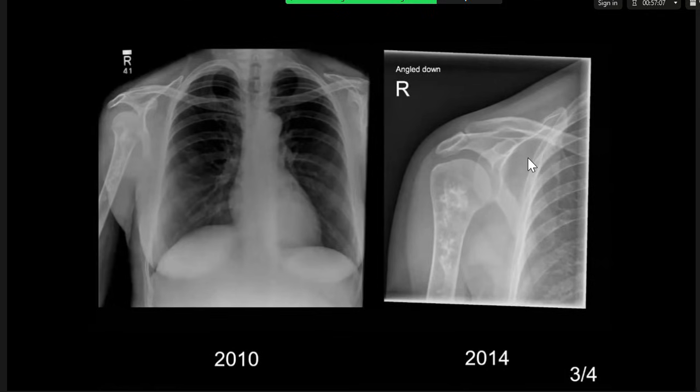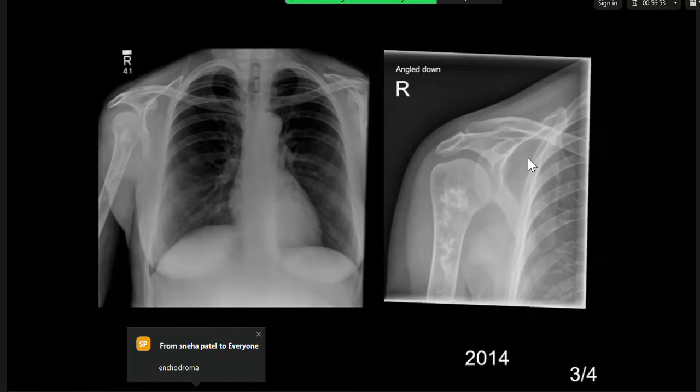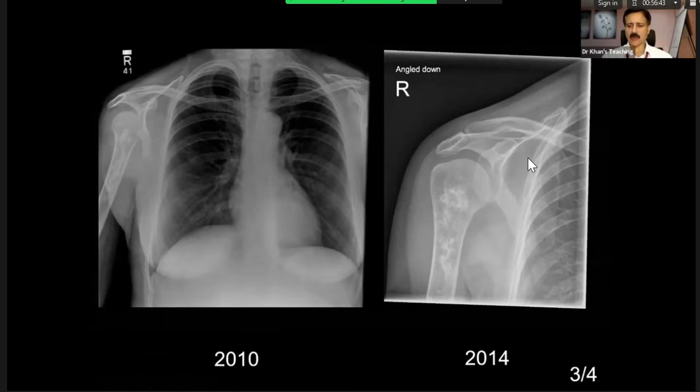Overall, broadly, it appears to be in the same distribution in length, but what I would be looking for is endosteal scalloping and increased lytic lesion, and there is increased lucency in the inferior aspect of the lesion. This, alongside pain, is concerning for malignant transformation, so I would need to further evaluate with MRI. Right. So the concept is that if it becomes malignant, it might eat up the calcification or the chondroid matrix. So there will be destruction and it might become more lytic or lucent.